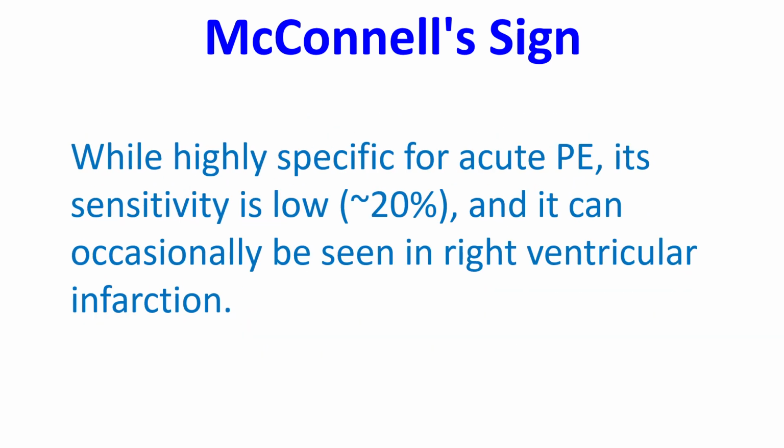While highly specific for acute pulmonary embolism, sensitivity of McConnell's sign is low, about 20%, and it can occasionally be seen in right ventricular infarction.